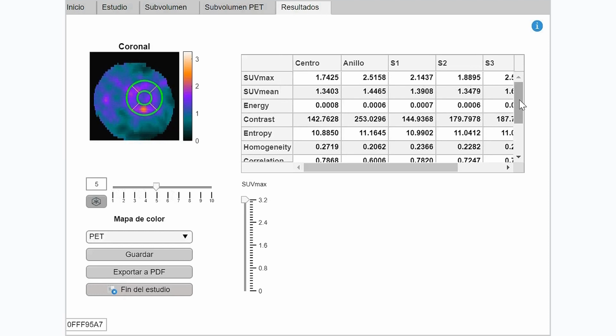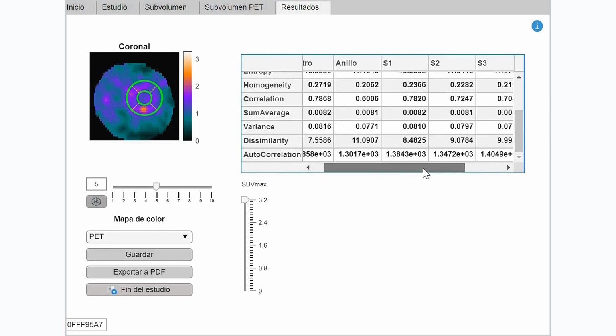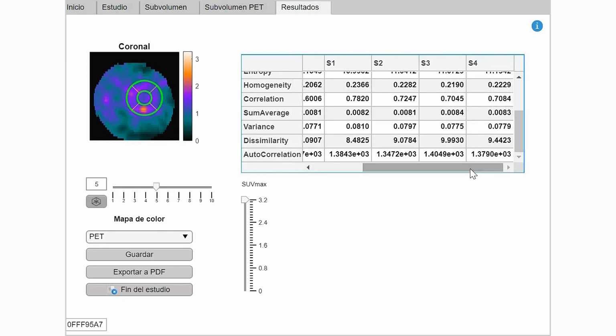Finally, the last window of the tool is shown, in which the final slice of the patient's PET image in the coronal plane is generated and divided in 4 segments, as well as a table showing the maximum and mean values of the toroidal region. This way, the user can interpret the values and determine if there are any infection focuses leading to a possible endocarditis.